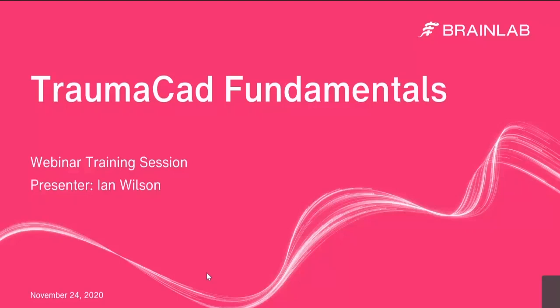Okay, so TraumaCad. TraumaCad is a software that has been in the market for about 10 years. It's a product, it's a solution offered by BrainLab. Okay, so let's go ahead and go straight into TraumaCad.